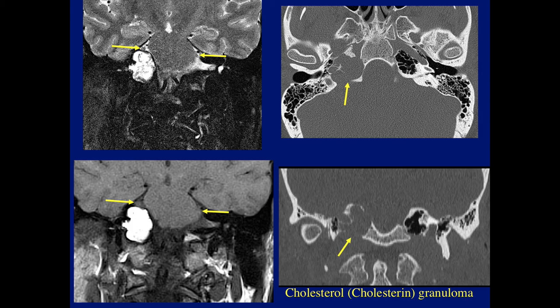Interesting, when I looked at EPIC last night to confirm that this was the case, it's listed as cholesterine, not cholesterol, which I guess is another term that people use. It was not listed as a cholesterol granuloma, but cholesterine granuloma. So again, the importance of doing both CT and MR in skull-based lesions. And I'll show during my talks many cases where that's important.